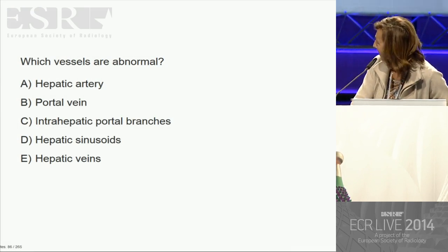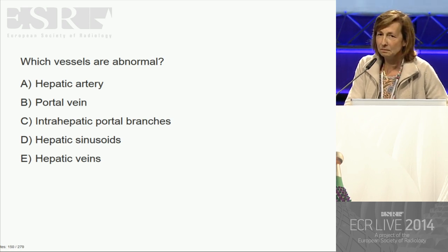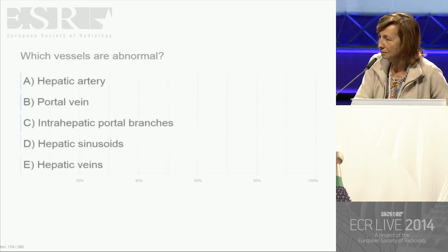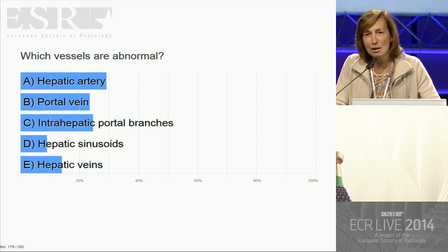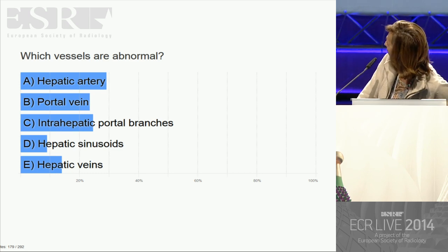Okay. Okay, let's have a look now. I was a bit too enthusiastic. There are still some lessons you can learn. Well, I don't know exactly what is your favorite choice.